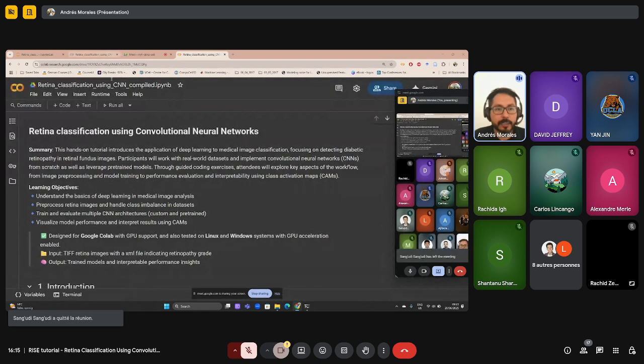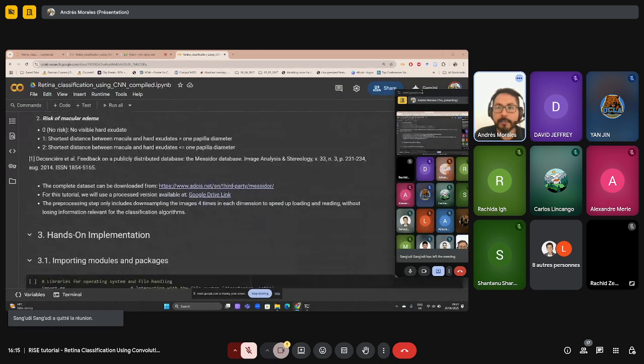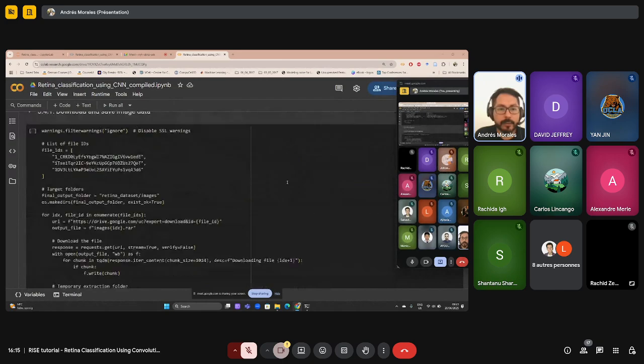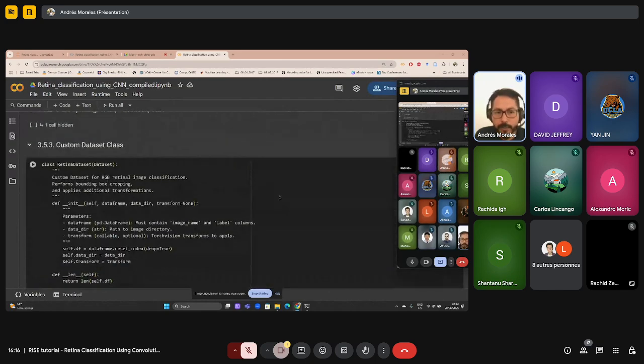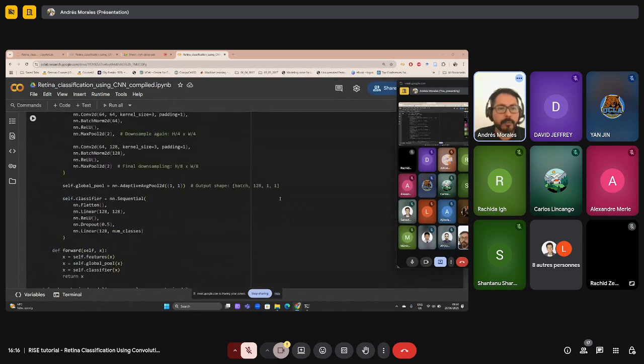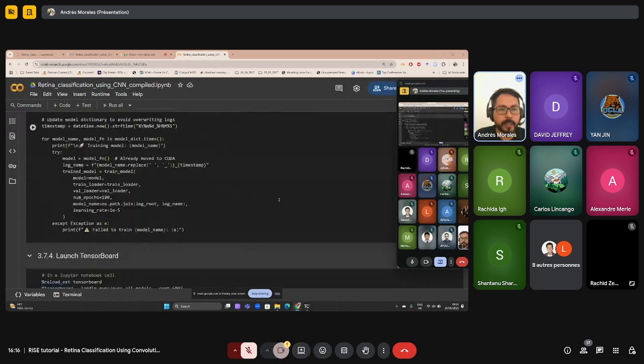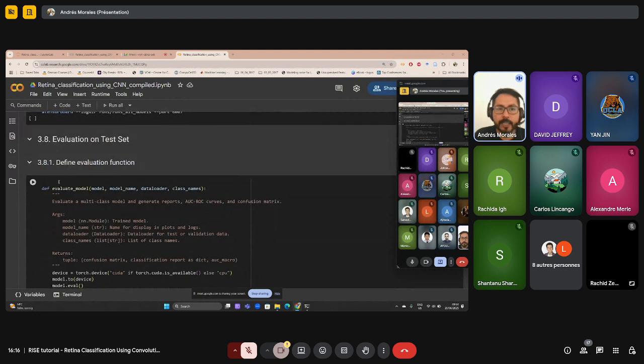So in the background, it is still doing the calculations. So you can run the calculation. It will take probably 10 to 15 minutes to run all the calculations. But we wanted to go to the analysis of the data. Yeah. So now we evaluate this.